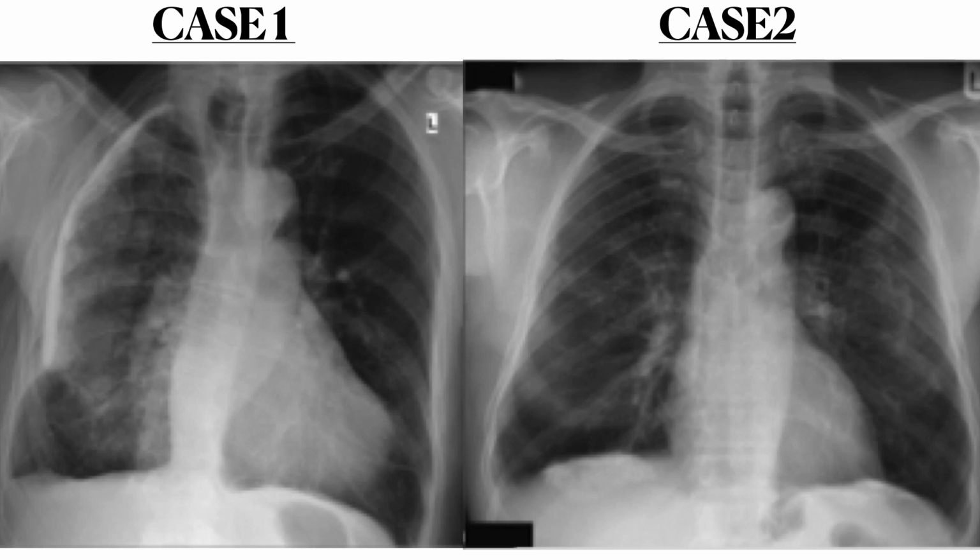And here we are going to move to cases. We are going to start with the first case, where we see an extensive unilateral pleural thickening due to calcification. And as we said, in such cases, patients have had previous TB.